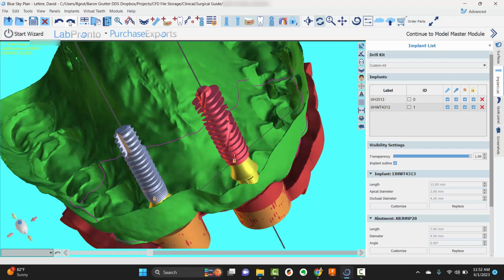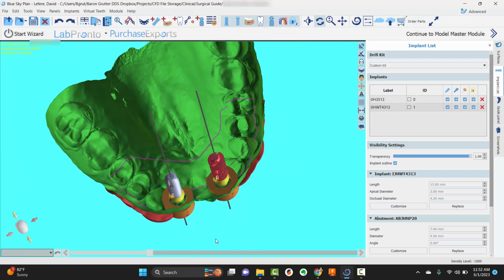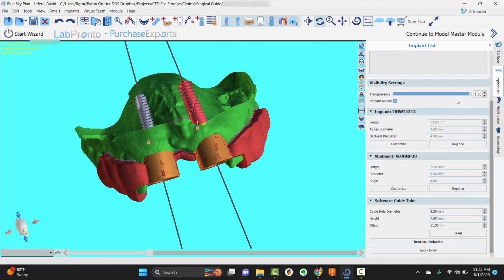Well, undoing isn't, there it is. Sorry, kind of pointless. I was just going back to where it was the full length, and there it is. So that's where it was when I planned it. Okay, let's go ahead and change these back for just a minute, or we'll keep this.